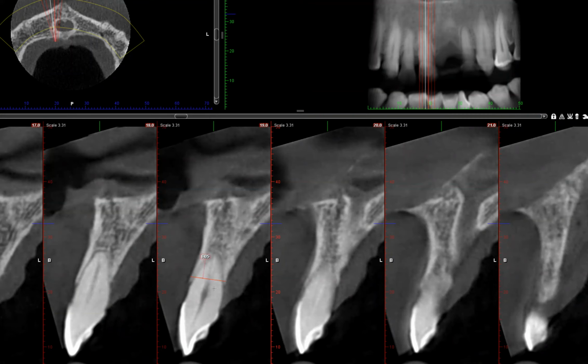Looks like we've already lost some periodontal bone, as I see that the alveolar crest is more than 1.5 millimeter away from the CEJ. That's about just over 3 millimeters. So the patient has lost some bone. And it is possible that in a healthy state, this buccolingual width would have been even thicker than what I'm currently measuring, but I'm getting somewhere around 6 millimeter.